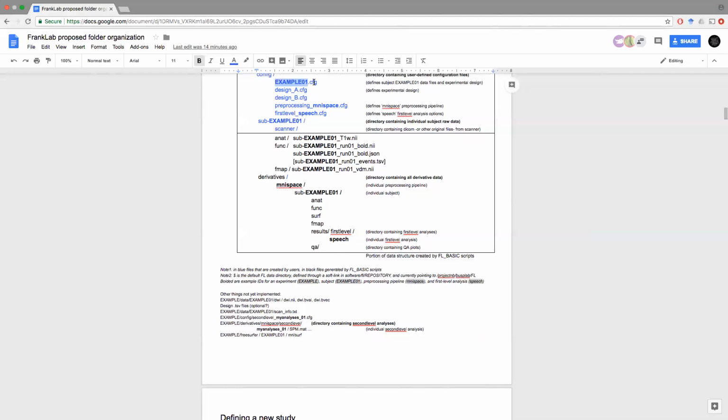As long as in the structural field of this file that specifies the source of your functional and structural data, you point to the anatomical data that has been generated by FreeSurfer, the pipeline, when you run the import step, will, in addition to just importing the structural data, also import the FreeSurfer generated files that it needs for running surface level analysis, and it will do that automatically.